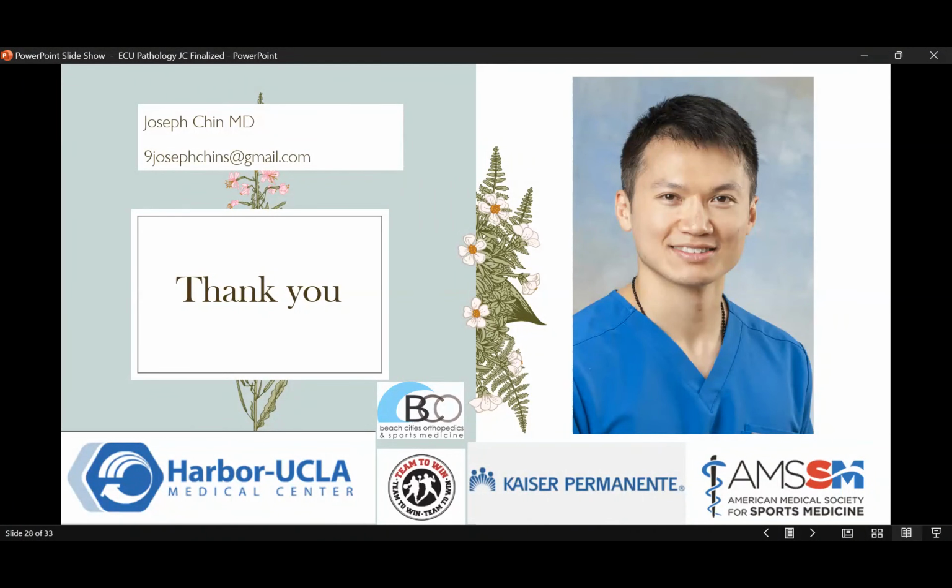And actually, for your ultrasound nerds out there, there's a structure right next to the subsheath called the linea jugata, which I can sometimes see with ultrasound. And these are longitudinal fibers adjacent to the ECU within the subsheath that also provide stability. And I've seen this in a dissection.